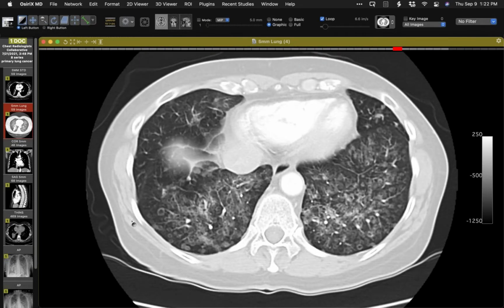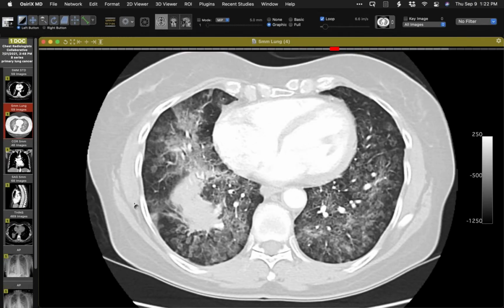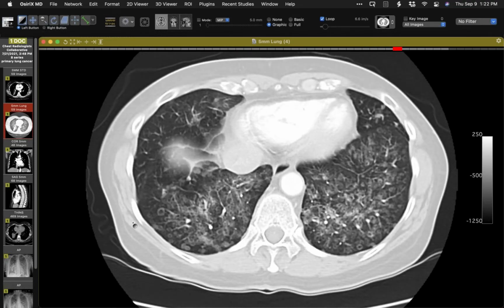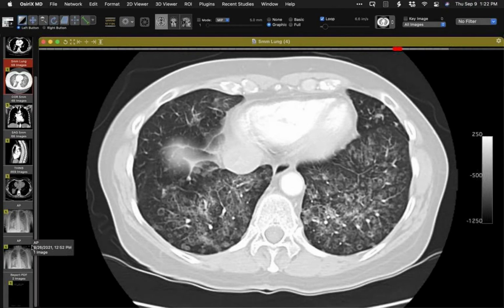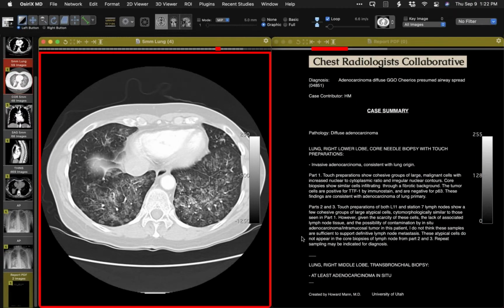We've certainly shown this before, certainly with the large mass and the rest of the appearance. This is consistent with tumor, presumably with tremendous aerogenous spread, I would think. And then just these interesting growth patterns of tumor growing throughout both lungs. This is a TTF1 positive adenocarcinoma.